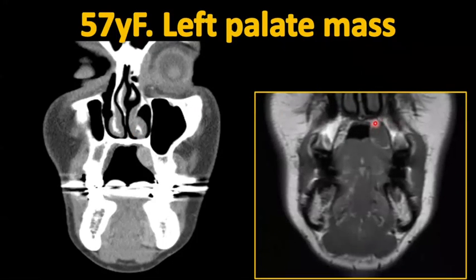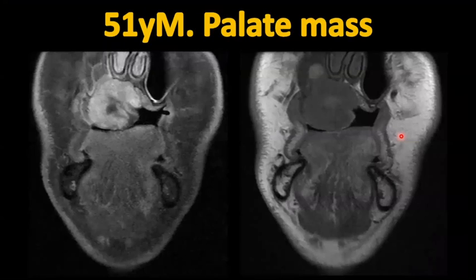This same lesion on the coronal, you can actually see the submucosal fat over the top of this lesion, which is not invading into the bone. Yes, you need to have bone windows to look at this. This is a little more unfortunate case of a much larger lesion, and you can see it looks like it's growing up here into that right maxillary sinus. This was actually a low-grade neoplasm. It was not resected because this patient had many other malignancy problems that couldn't be taken care of.